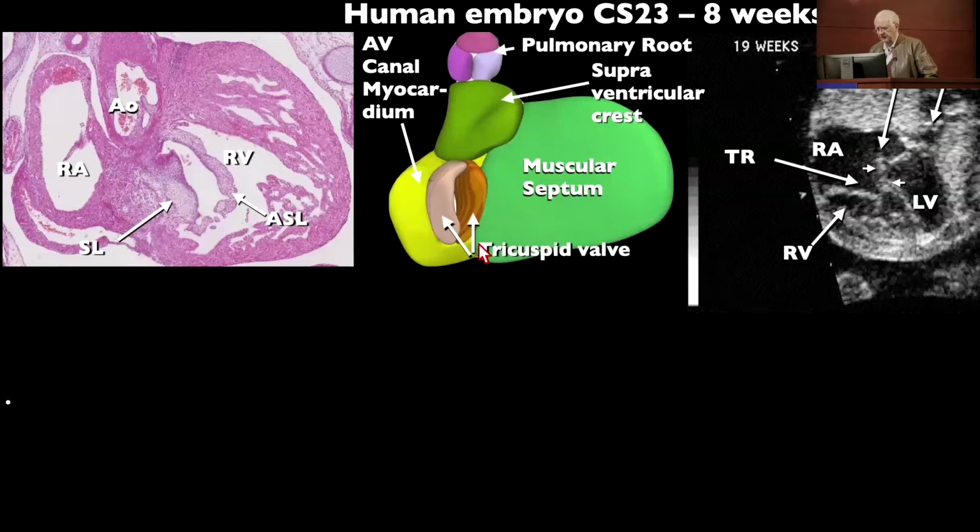In the center is a new way of looking at this from a paper by Hikspoors, Lamers and Anderson, showing reconstruction of the various parts of the heart in various findings.